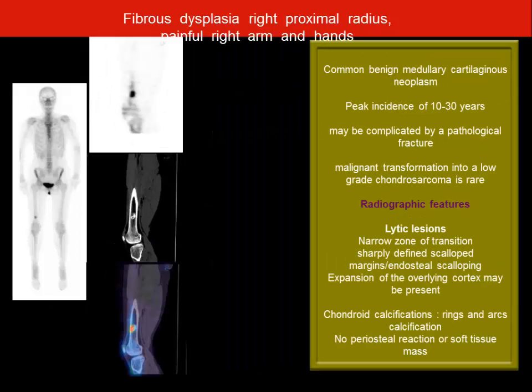Okay. And another incidental finding, focal uptake is again non-specific, whether it's on the bone scan or on the SPECT scan. And in this case, there is calcified sclerosis in this area, and an enchondroma was diagnosed in this patient.